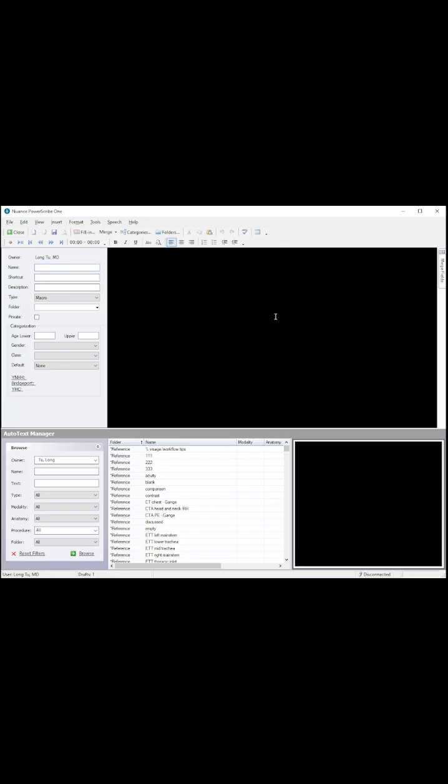So we could have said, from here, post-operative changes, status post transsphenoidal resection of pituitary, period. No evidence of residual/recurrent lesion, period. Instead of doing the macro that, and then could have named this and saved this.